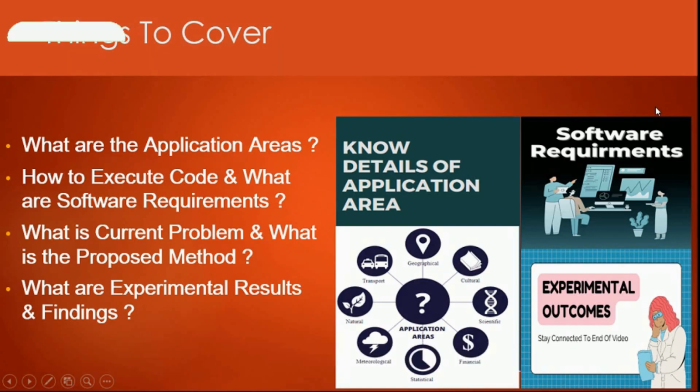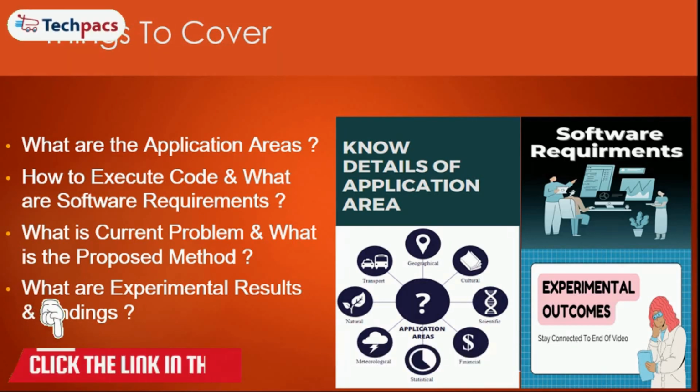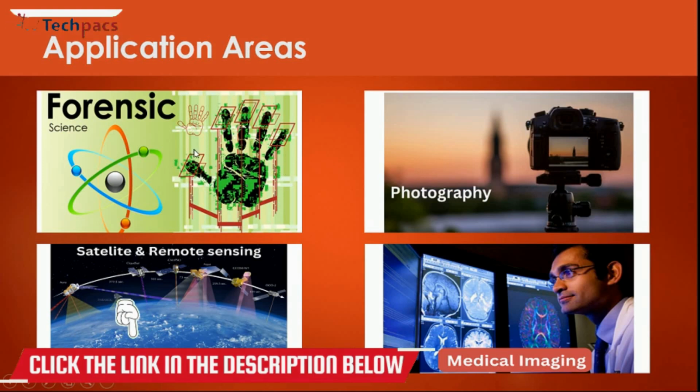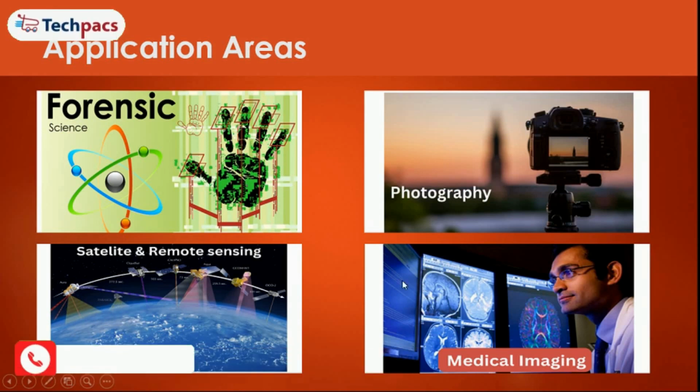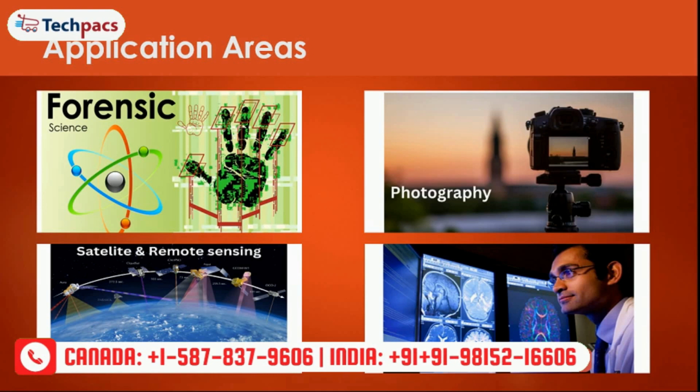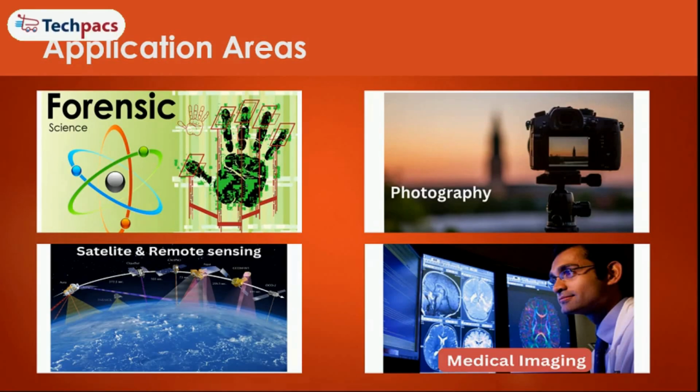So as I already told, the project is related to noise removal from images, especially medical images. It is not restricted only to medical, but can be used in many areas like forensics, satellite remote sensing, photography, and medical images, where ultrasound or some device-related noise affects the images, and in order to remove that, there is a requirement for filtration so that the required information can be extracted out. So now let's see the code.